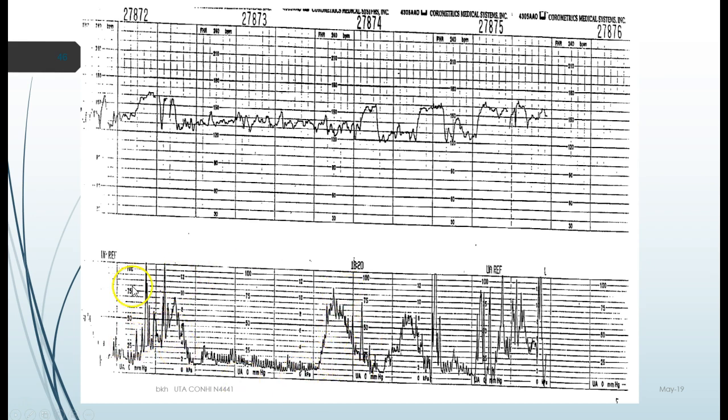These are all contractions. This kind of stuff on the baseline right through here, she's pushing. That's what these big spikes are, these big spikes over here. Contractions don't spike like that. They're usually nice and rounded, more like this one. This squaring off and those big spikes typically mean she's pushing and tightening her belly, causing pressure up against that little button on the tocodynamometer.